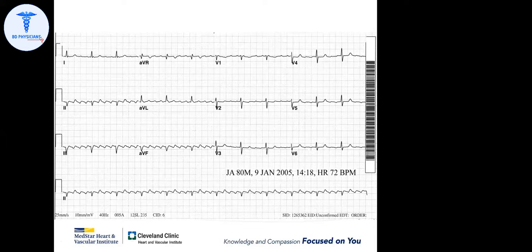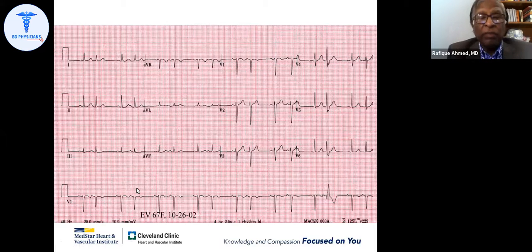So this is another arrhythmia. If you look at P wave, QRS, and then there is a QRS complex. P wave, QRS, and then there is another QRS. And I think there is another P wave here. So there is a P wave, there is a premature beat. This is atrial premature beat, then sinus rhythm with atrial premature beats in a pattern of bigeminy. So frequent supraventricular premature beats in a pattern of bigeminy.